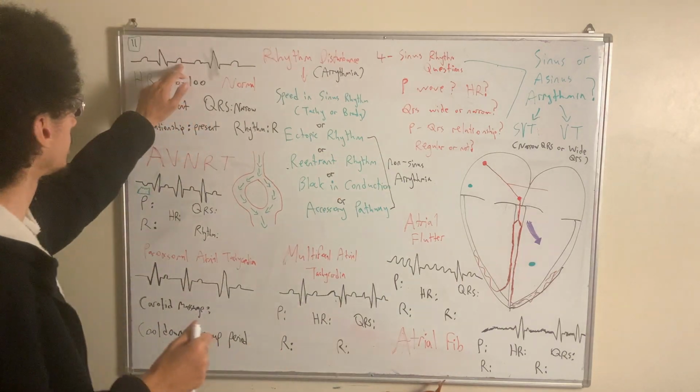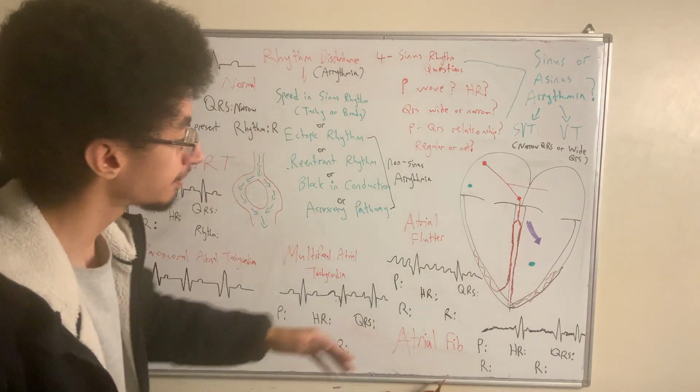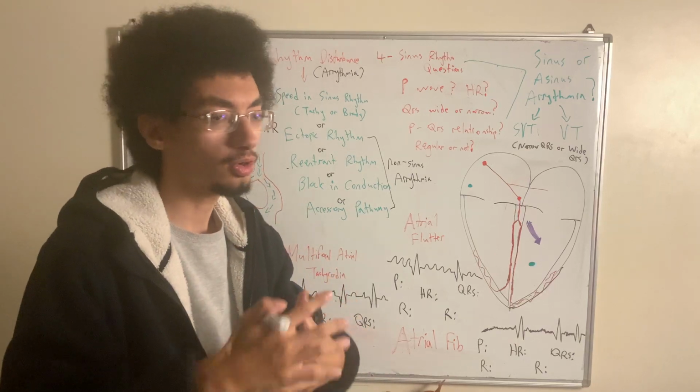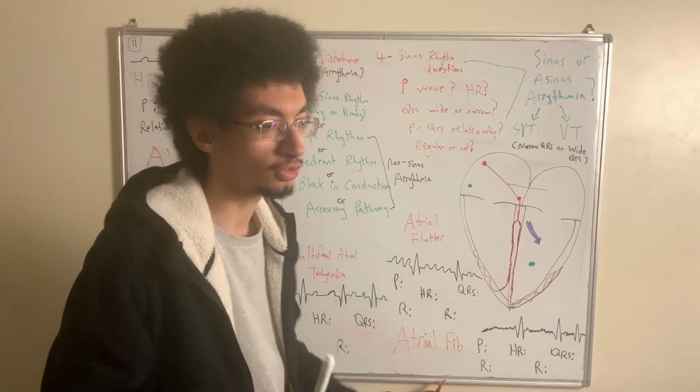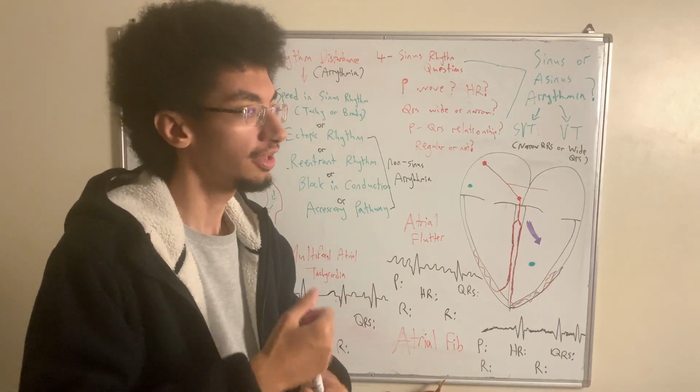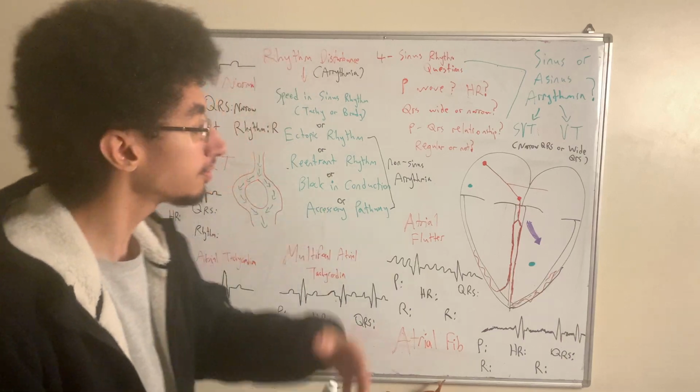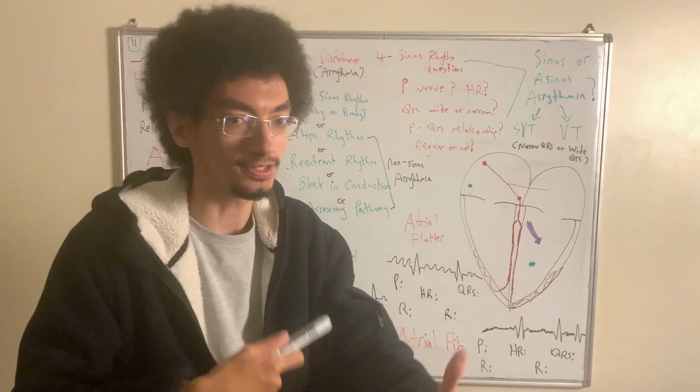The reason why there's a flat line following ventricular depolarization is because following depolarization, there will be what is known as a refractory period, in which the ventricles depolarize, and then they will take some time to relax. There will be some time to wait for repolarization to occur.